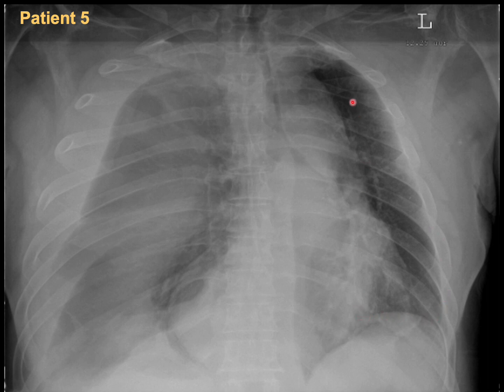So what I see on the left side from the lung is okay, but when you go to the right side, well, the right side is very homogeneous, whitish. Okay, and I cannot see very well the bronchovascular markings on the right side. And the mediastinum is pushed totally to the left side, other side from the trauma side, and I think we have this extension from this side as well. So most probably we are having here a massive hemothorax on the right side with what we call tension component. The mediastinum is pushed to this side, and also there is some overlapping with the extension from the right side to the left side here.